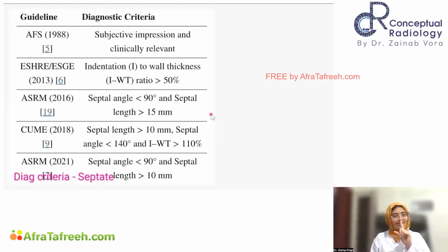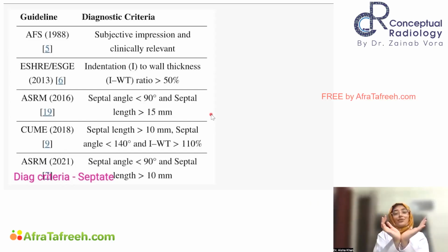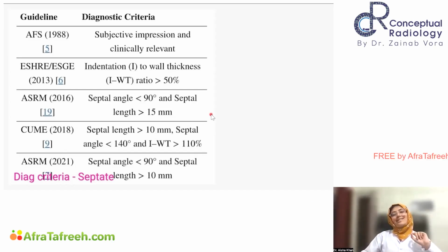We discussed 1 centimeter, one figure of 1. Arcuate uterus less than 1 centimeter, and septate means the septal length of at least 1 centimeter or more than that. Angle can be quite divergent. That means 140 degrees or less than that. And then the internal indentation to the wall thickness ratio of more than 110%. Okay? So this is very simple. I will tell you the crux of this.